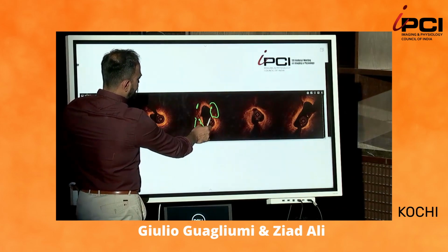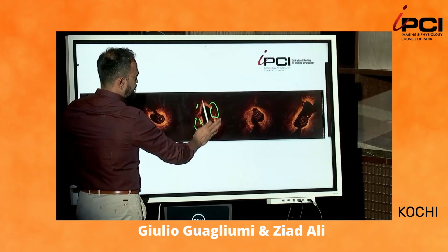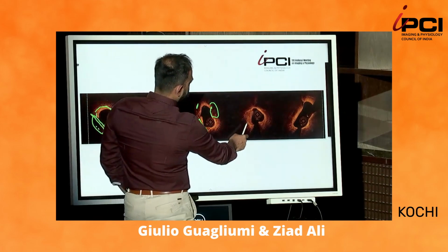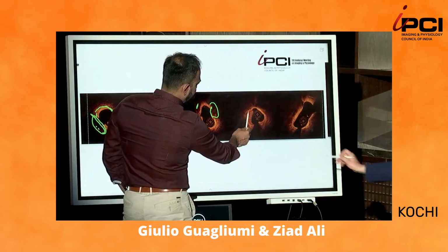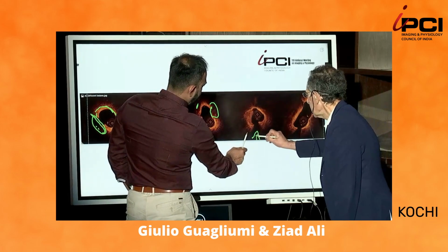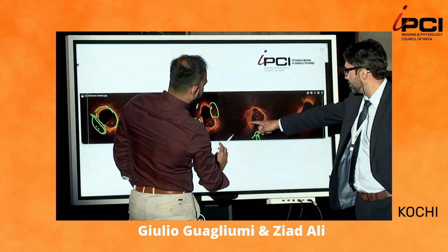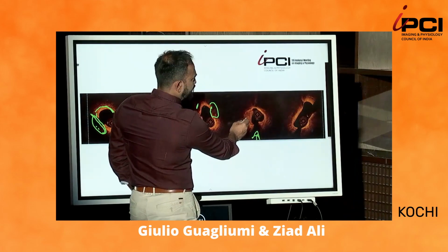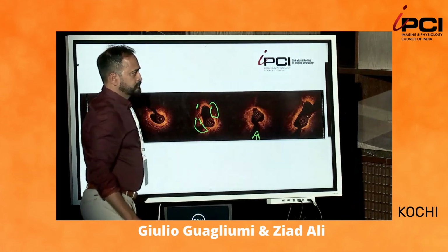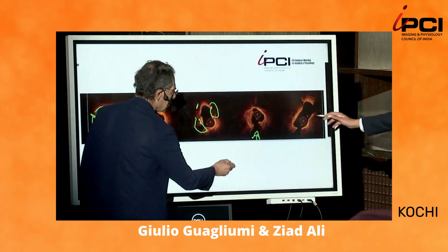But the calcium is not 180 degrees, not a problem actually. The stent will expand. And we have some calcium, maybe deep calcium here. Calcified plaque. What do you think about the shape and the form of this cap? Why does it look like that? This is a healed plaque. Yes. Correct. Very good.